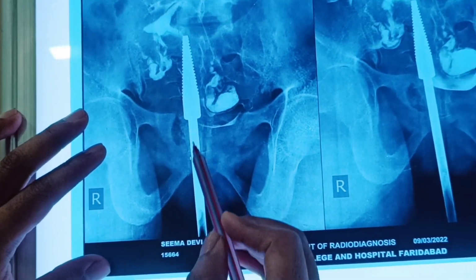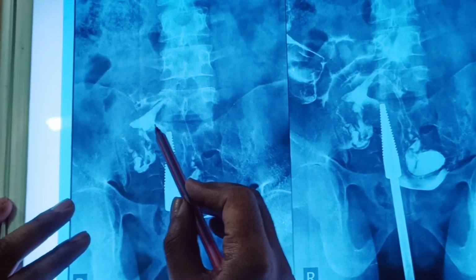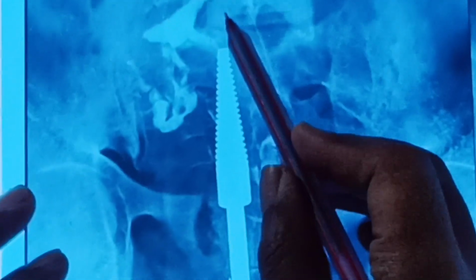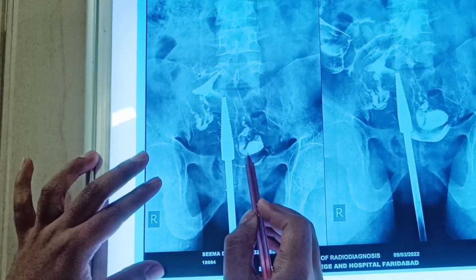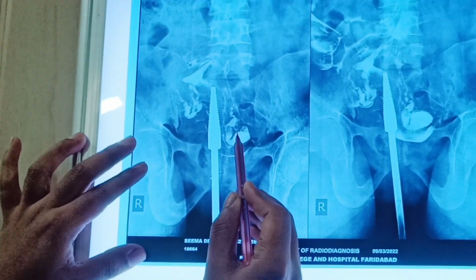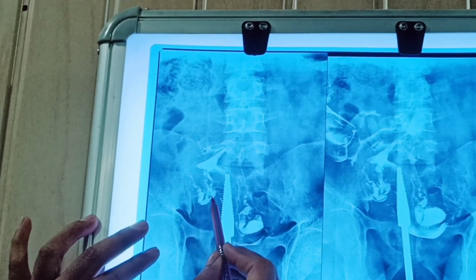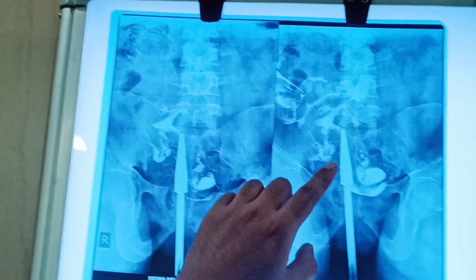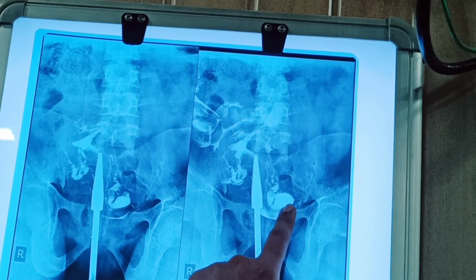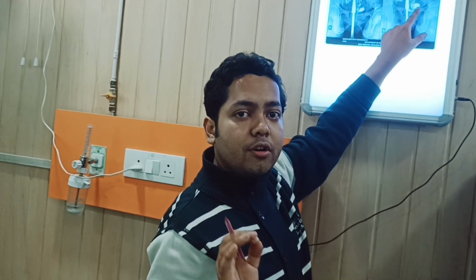Now this HSG film is also showing the Leach-Wilkinson's cannula with the cervix, the uterine cavity and bilateral tubes. Now in these tubes you can find that the left sided tube is dilated at the end. So this is hydrosalpinx. So there is hydrosalpinx on the left side, whereas the right sided tube anatomy is also not proper. There is beading of the tube. So beaded tubes and hydrosalpinx are markers of tuberculosis. Tuberculous salpingitis is very common, which is a cause of genital tuberculosis and infertility in patients.